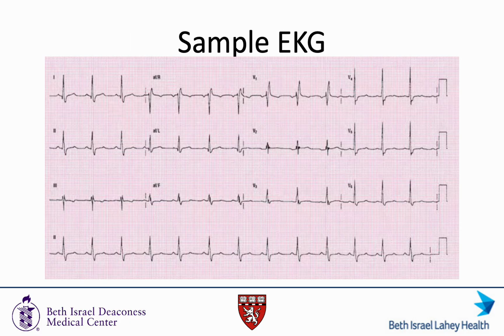This is the sample EKG that you received earlier this month. If you haven't had a chance to look at it yet, please feel free to pause the video and take a few minutes to review it. We'll be going through this together later in the video.